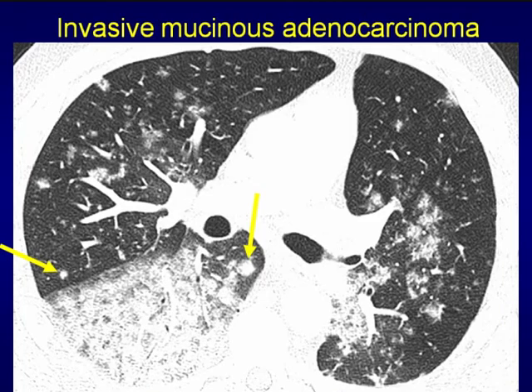Here's a nice example of invasive mucinous adenocarcinoma, showing a very similar pattern. Invasive mucinous adenocarcinoma certainly may present with ground glass nodules, but in our experience, it much more commonly presents with these dense nodules. And if a patient has both ground glass and dense nodules, usually we use the dense nodules in our differential diagnosis. So again, you see smaller nodules. Notice it's distant from the fissures. You have bigger nodules, and then these very large confluent areas of consolidation.